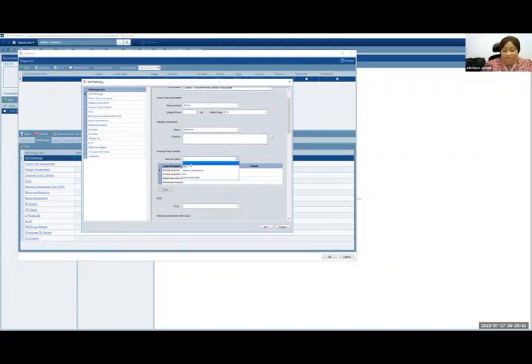Is this tumor an invasive tumor? Yes, it is. And what kind of invasion? There is perineural invasion. Yes. Is it focal? Is it extensive? Is it just present? They just said there's perineural invasion positive, and they didn't tell us more than that. You select present, not otherwise specified.